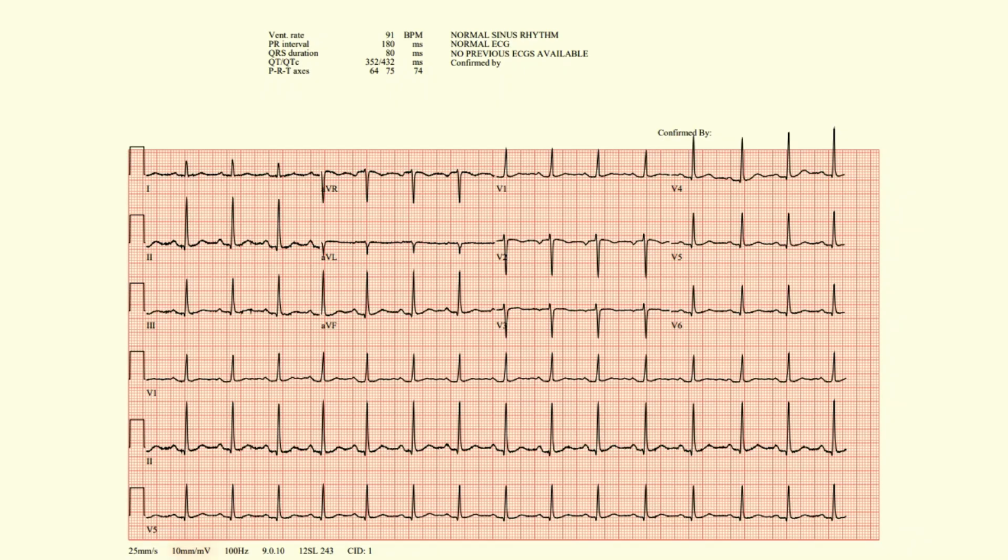What about 100 hertz? What's that? Any ideas? Frequency of the electrode, that's a good guess. This is what's called the low-pass filter. So this filters out noise. Low-pass filter means low frequencies are able to pass through. So everything above 100 hertz is going to be filtered out. That's likely non-physiologic. That's probably noise we don't want to see. And you can change those filters, which is sometimes relevant in a way that I hope to convince you of in a slide or two.